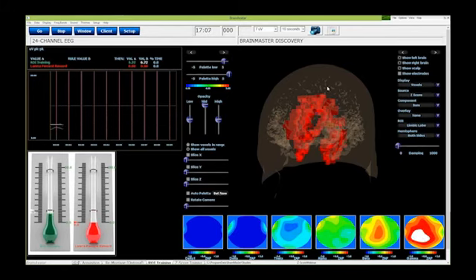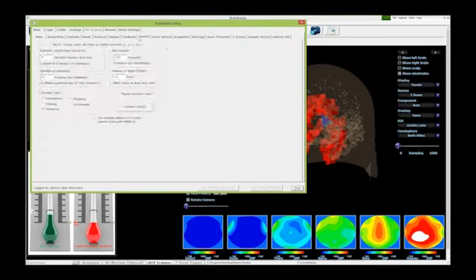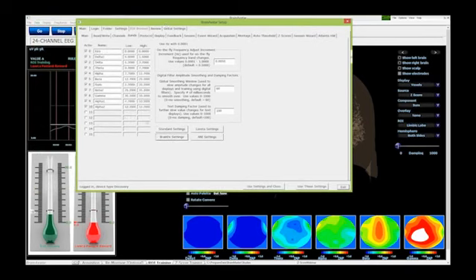Why can't you see SMR in voxels? Well, that is because what you're defining as SMR is not one of the bands that BrainDx is built on. You see, BrainDx, and let's go right here, was developed with these bands in mind.